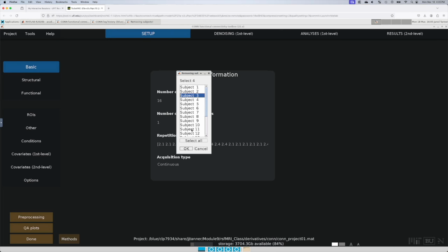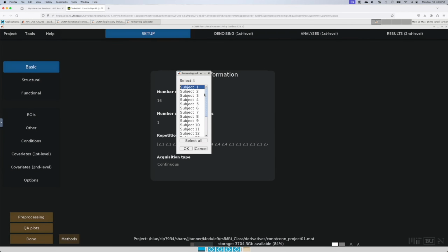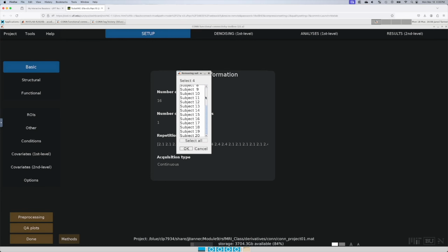maybe 3, maybe this is a command. Oh, you can double click on it. So 3 is gone. 11 should be gone. 13 and 15. Oh wait, no, that's actually getting rid of them. 3.